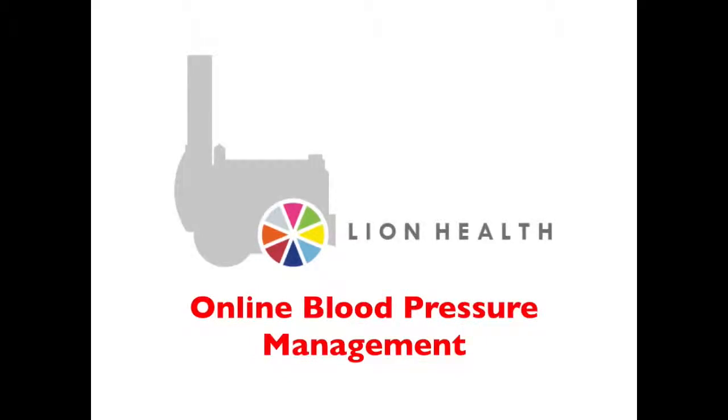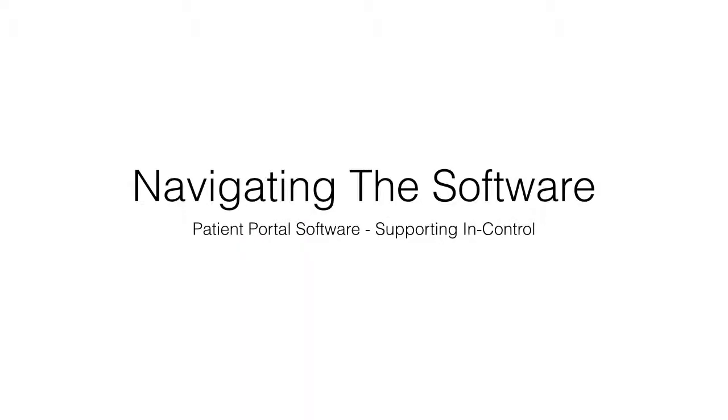This video is designed to run alongside our online blood pressure management service known as InControl, and we would suggest that you use this alongside the advice from your healthcare professional. What this video is designed to do is just to help you navigate around the patient portal software.